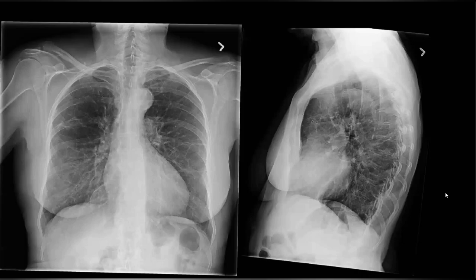Very good description. Female patient, extensive reticular markings. You reached the right diagnosis, but one thing that might have earned points would be lung volume. There are some emphysematous changes in the upper lobes, and disease is more pronounced in the mid and lower zones.